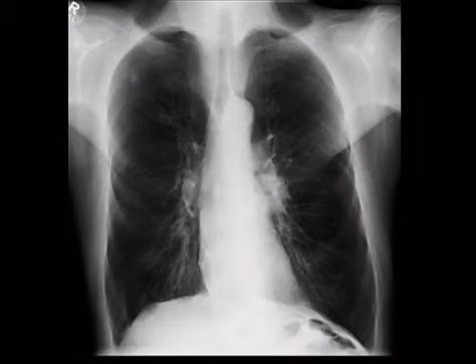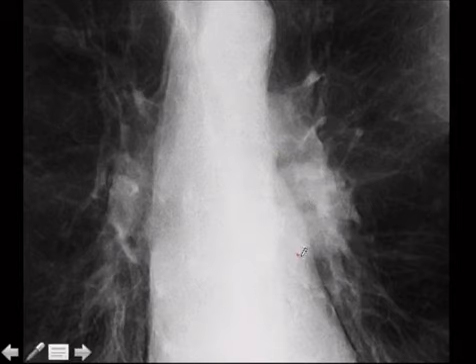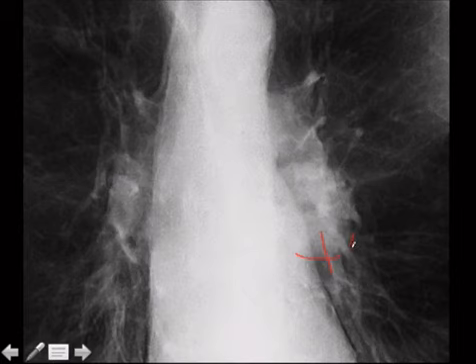So we've got a chest x-ray here. Patient's got pretty bad emphysema. We zoom up on the hilum there. We can see that there is a mass, but we can also see the vessels clearly through that mass. We can see, okay, so mass here, right? But then you see a vessel running right through that. You can see here also a mass, right? Vessel. So we can make out both of these things as separate.